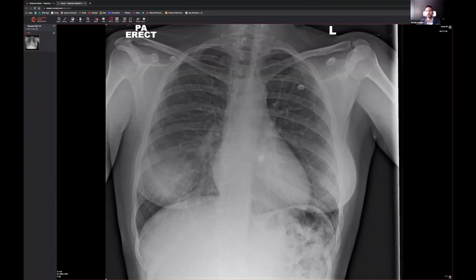So just be careful. When you see any sort of shadowing, opacification, it is very tempting, even in chest pain, to say, oh, it's consolidation. But have a really close look, and make sure that there is no evidence of any destructive processes. There's no hilar lymphadenopathy or anything else that may suggest that this patient's got a little bit more going on than what meets the eye.